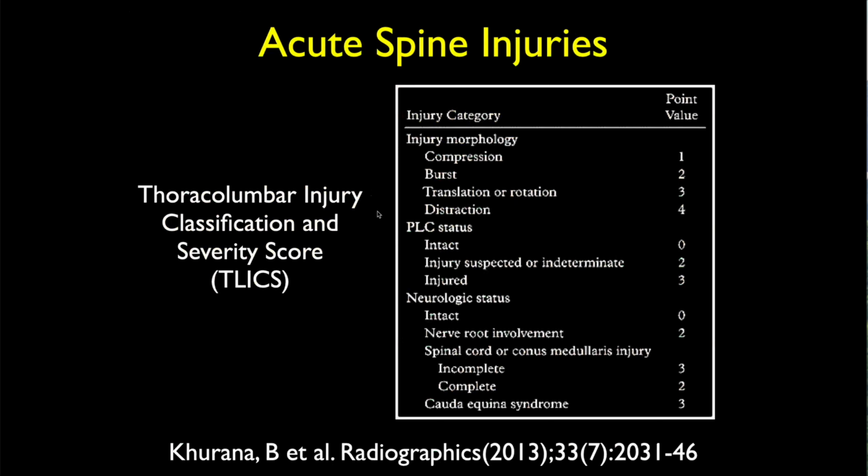It really goes to hospital emergency rooms. But I'm going to go through this category because I think it's worthwhile for you to know. And for those of you who are going to be involved in trauma centers, you just have to check and see what kind of grading system they like to use to make clinical decisions. It may be something similar to this, or it may be this one.